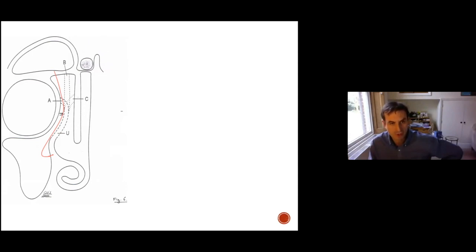Whereas in a type A situation, where the uncinate is attaching to the lamina and creating what we call the recessus terminalis, you've actually got a slightly separate outflow. And that becomes pathophysiologically important, because particularly if you get an odontogenic sinusitis that's originating in the maxillary sinus, if you've got a type A attachment of the uncinate, then that pathology will be confined to the maxillary sinus. Whereas if it's a type B or a C, that pathology can spread and involve the frontal sinus and also the anterior ethmoids.